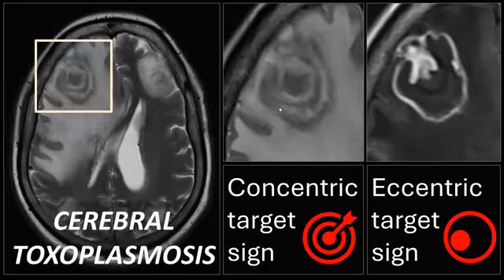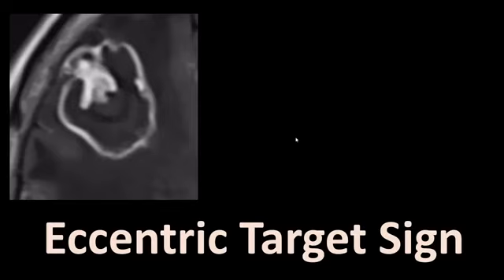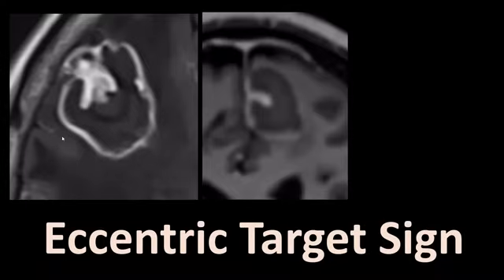How do you explain those signs? With the cyst with dot sign, it was basically a protective cyst surrounding a larva. Is that the case here? Not really. It's also a parasitic infection, but it's not as if we're now looking at the larva. This is not how this works here. This is an area of inflammation caused by a parasitic infection. We can call it toxoplasmosis abscess, although it is not a true abscess because it doesn't contain pus.